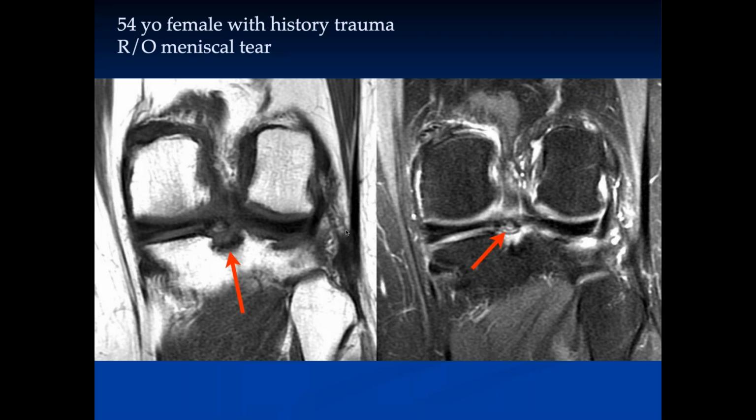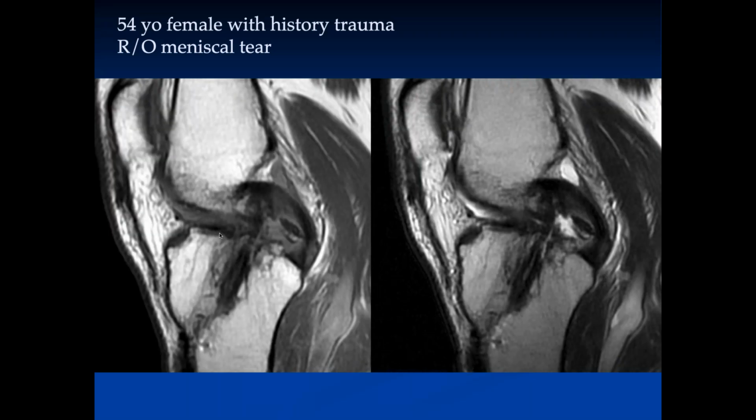So this is another bony avulsion. This is where the bone cracked and a little piece of bone was pulled off, and there's the menisco-tibial attachment. It's just that the little piece of tibia is no longer attached to the tibia. So this is another root avulsion.